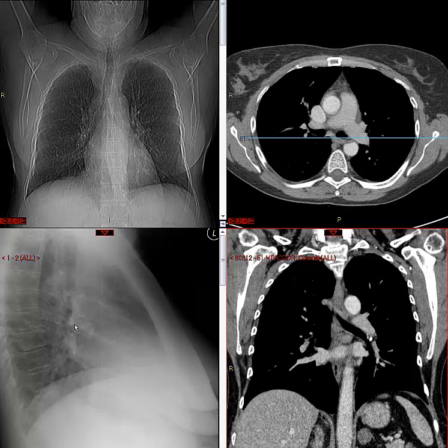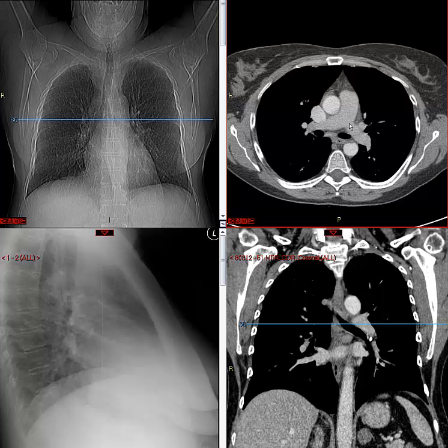Now the right main pulmonary artery is, if this is left main pulmonary artery arching over here, the right is always a little bit more anterior from that. It's just a vague density in this area. That's right pulmonary artery. You can see that it's more anterior on this axial view. Here's the left main pulmonary artery, a little bit more posterior. Here's the right artery, a little bit more anterior. And if you're looking from a lateral view, see how it's going to be coming right at you, which is why it's relatively round on this view.